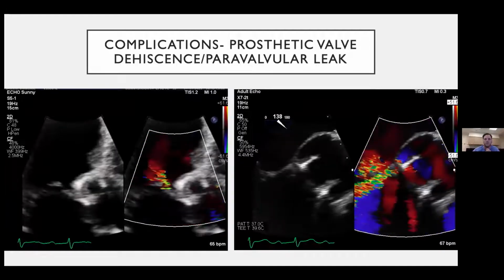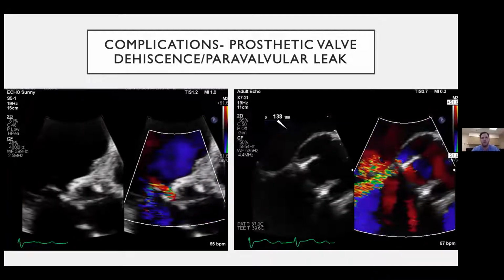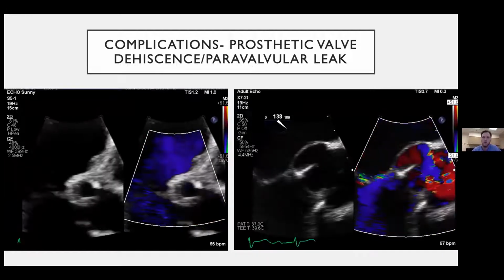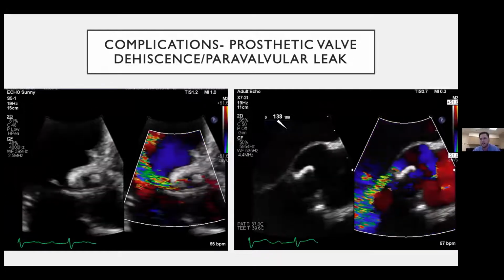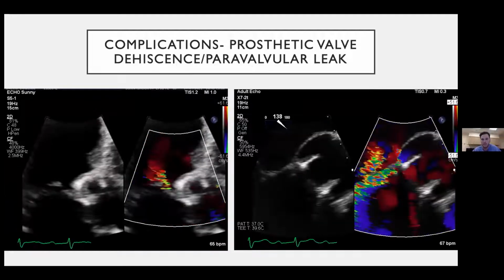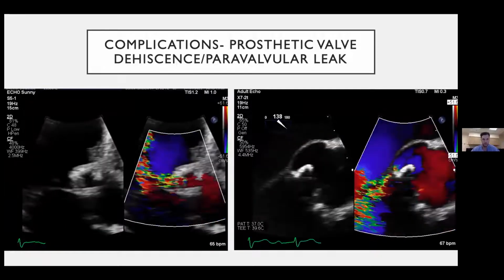Okay, so before we get to some multimodality stuff, we'll move on to prosthetic valve dehiscence and paravalvular leak. Prosthetic valve dehiscence refers to breakdown of sutures leading to partial or complete detachment of the prosthesis from the annulus. It can be a catastrophic complication, and these patients can really tend to decompensate quite quickly.